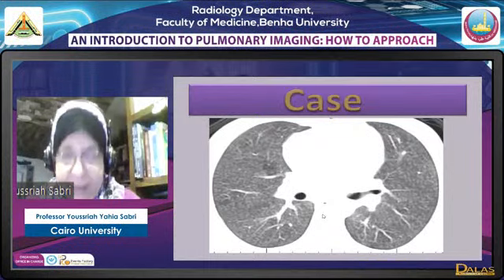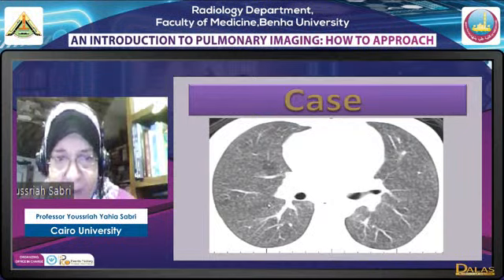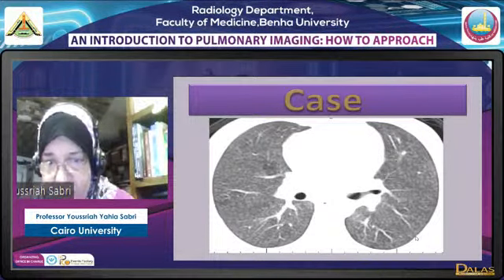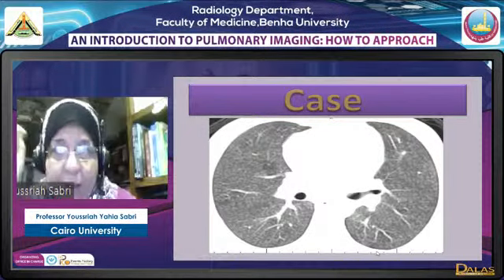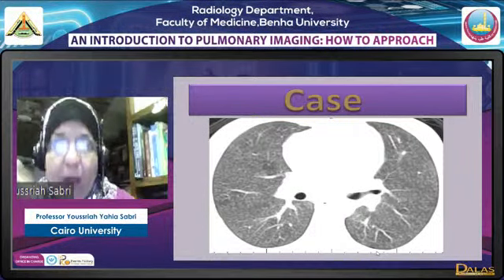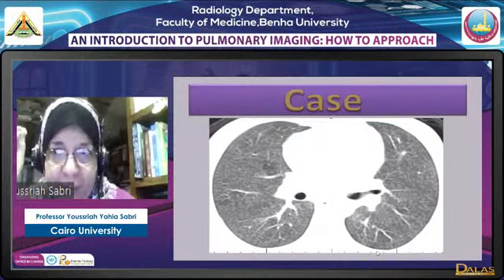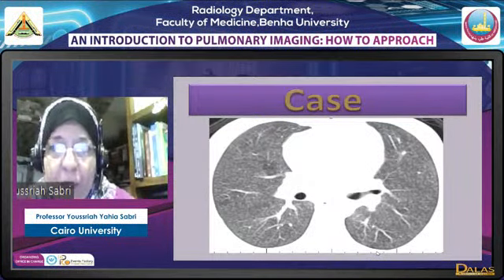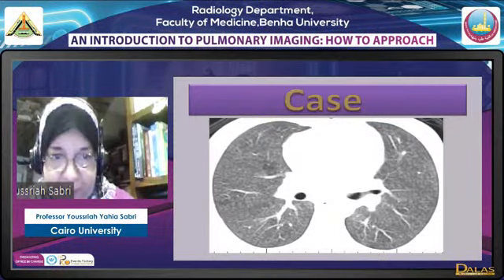In centrilobular nodules that are numerous like this, you can see the fissure as a hyperlucency; you can hardly discriminate the fissure. And these numerous centrilobular nodules filling the whole lung, with relative basal sparing, are specific for one of the appearances of subacute hypersensitivity pneumonitis.